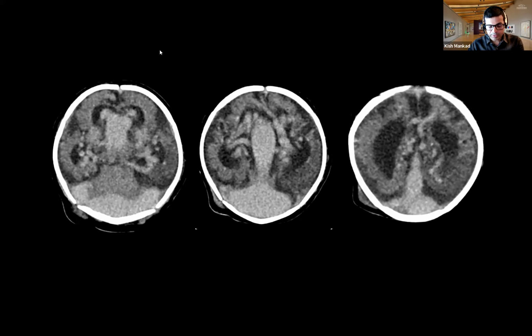And I can tell you that the child was in congestive cardiac failure. And the reason to do a CT scan was to check what's going on in the head. No other reason. It's not always easy to do an MRI scan in children like these who present with congestive cardiac failure. They have a lot of attachments and they may not even be MRI compatible. And yes, Dr. Sami is correct.